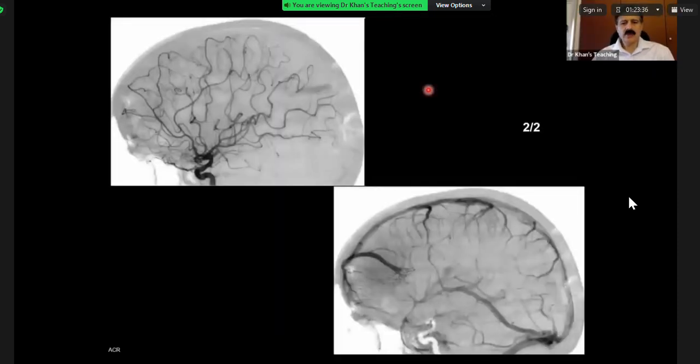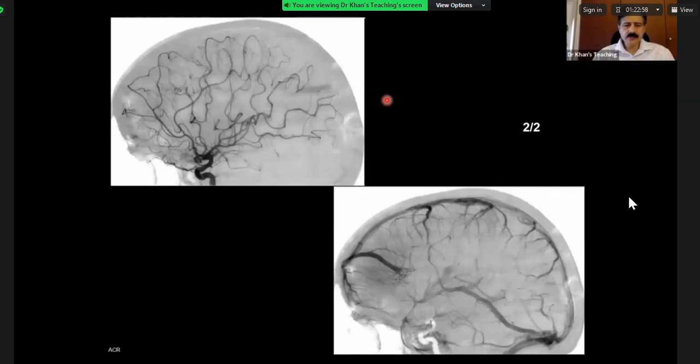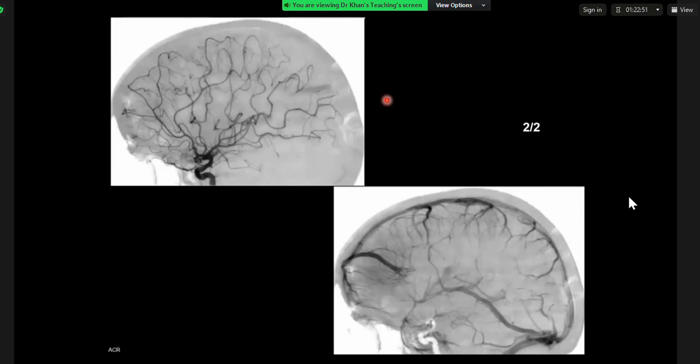I've given you an angiogram of the same case, and you have an arterial phase and a venous phase. Over to you. Okay, on the venous phase, it almost looks like what I was looking at on the CT. It appears to be in the right frontal, and I can't appreciate that area on the arterial phase, but on the venous phase, just below the superior sagittal sinus, there's a well-defined linear structure. Whether this is a cortical vessel, an aberrant vessel. I can see it on the venous phase, so it would be an aberrant cortical vein.